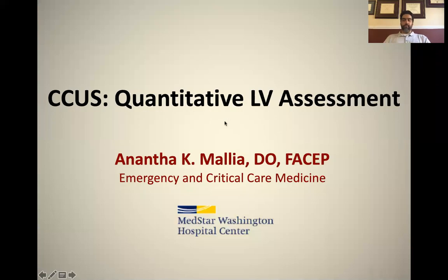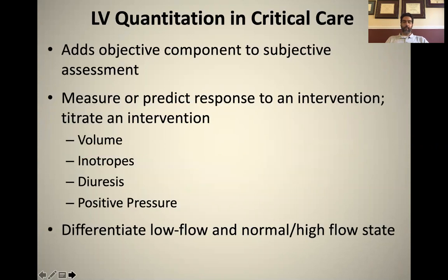Now that we've reviewed the basics of quantitation in critical care cardiac ultrasound and the basics of Doppler, let's move on to probably the most commonly used arena for quantitation of cardiac function in critical care, and that's the quantitation of LV function, or the quantitative LV assessment. So again, quantitation in critical care brings you objectivity and an objective component to a subjective assessment.